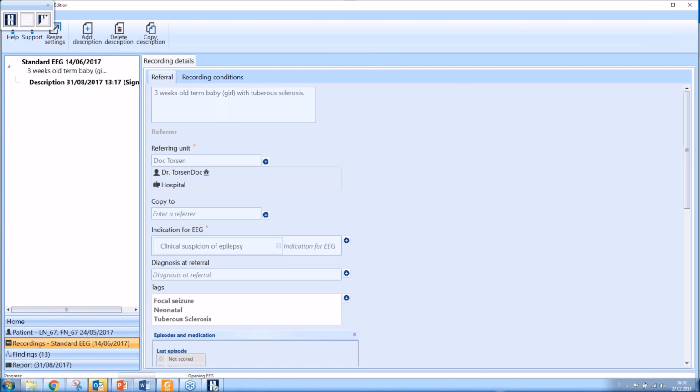And now I would like to directly look at the tutor's description. So I click tutor description here, and then you automatically open both the study in the SCORE application and also in the EEG.